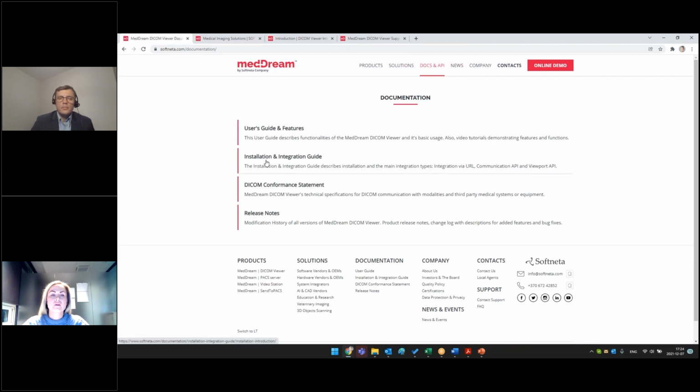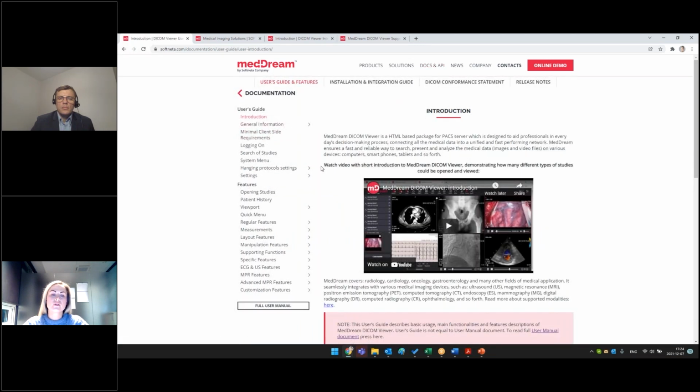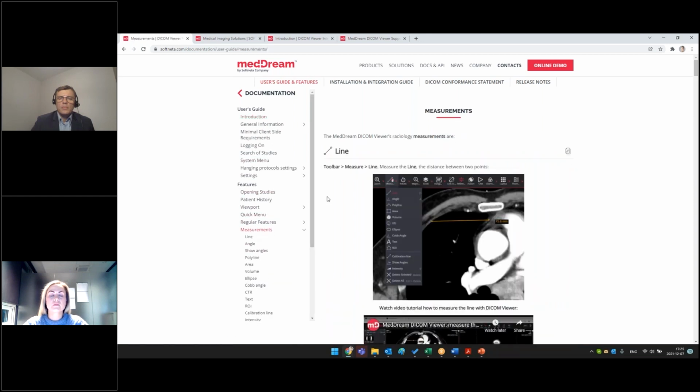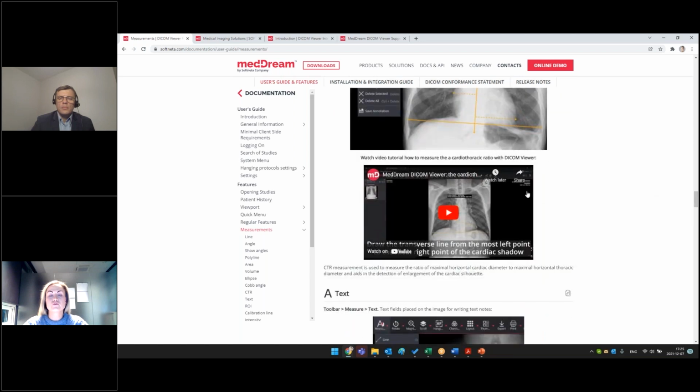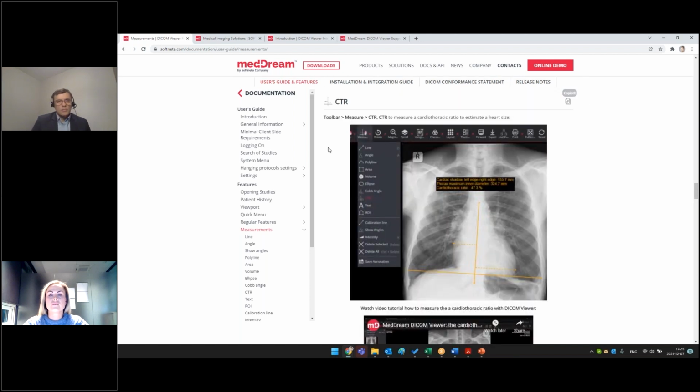Also, I want to present some news in the documentation page. We have the user guide with features here. Please pay attention that in this section we put videos. For example, now we present new features, but all the new features will go in this section. For example, if we have a new measurement like flat foot, it's not here yet, but it's going to be next week. Take the CTR measurement: it has a short explanation and a short video tutorial that you can easily share. You can simply send only the link to this measurement.